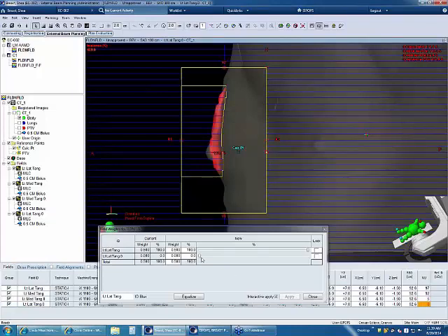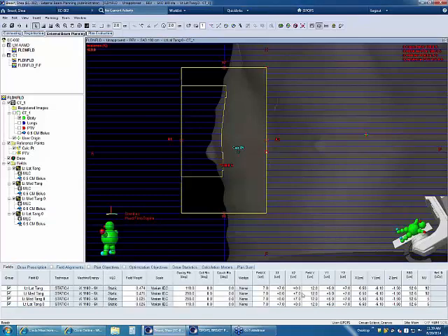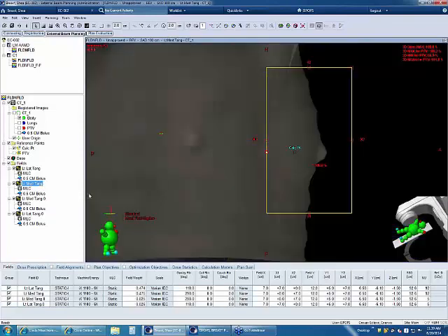Excellent. And I'm going to take my little slider bar here and move it just a little bit, lift up, watch the dose shrink away, only 3 monitor units, a little bit more than 4 monitor units, how about a little bit more? Not quite. There we go, 5 monitor units, I'm going to close it. Now I can come over here to my, let me see, I have a medial lateral, so back to the medial. You notice I keep going back to the parent field.